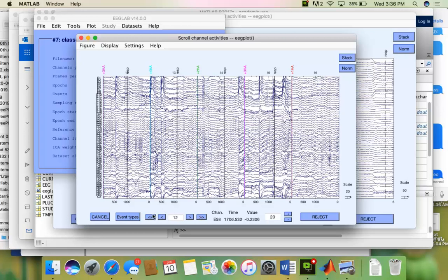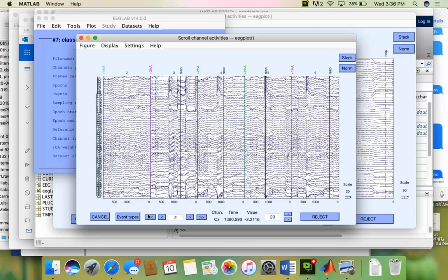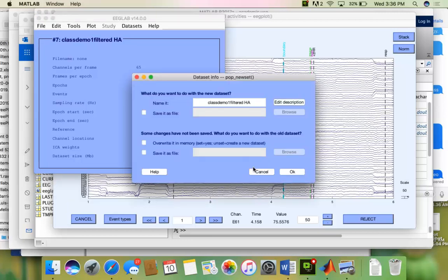Also notice that if we had really crazy stuff in our data, if you epoch your data first and you have one of the epochs that's just really bad, like in this case, you can see epoch 3 is really bad, I can actually remove that. And unlike if I'm working with the raw data, I'm removing the entire epoch.